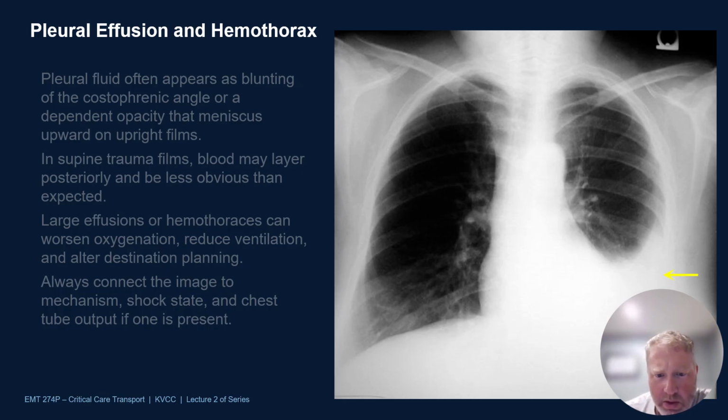So if you take a look here, all of this white out down here, that should be visible lung. It is not. It is white. So it is a solid of some kind. So a fluid of some kind. And this one's pretty significant.